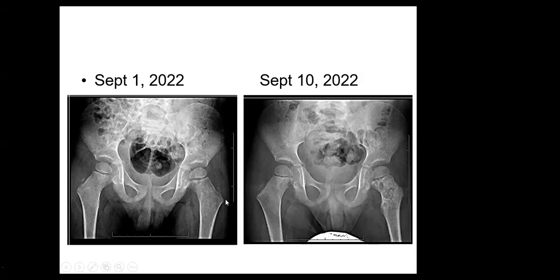Okay, so if it is rapid progressive bony destruction, is that of infection or tumor? Could be the infection and could be the tumor. Because the patient is a child, and aggressive bone destruction in a child goes mainly with infection, and then tumor, especially over a period of 9 days only.